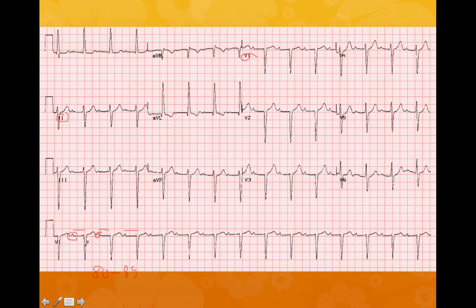Next, we can move on to the QRS, and we can say that the QRS is pretty narrow. We can say that the QRS is a narrow complex. And then the QT. Here we have the Q wave, and here we have the end of the T wave. Just a bit of a shortcut that's not perfect, but a bit of a shortcut in working out the QT: we can say that the QT is less than halfway between one QRS and the other QRS. So it's more than likely a normal QT interval.